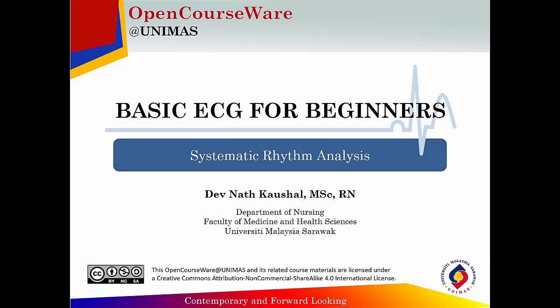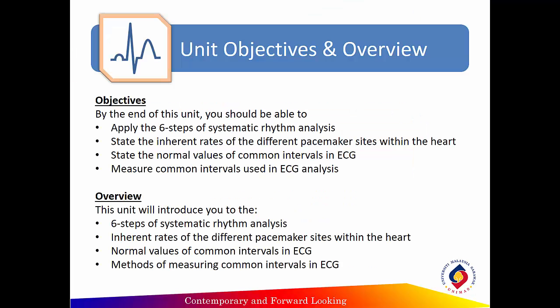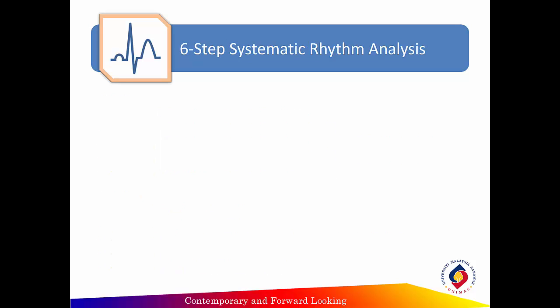Welcome to systematic rhythm analysis, which will form the basis for analyzing basic ECG rhythms. This learning unit will introduce you to a 6 systematic step approach to analyzing basic ECG rhythms. We will also be looking at common concepts behind these steps as well as intervals and segments in ECG rhythms.